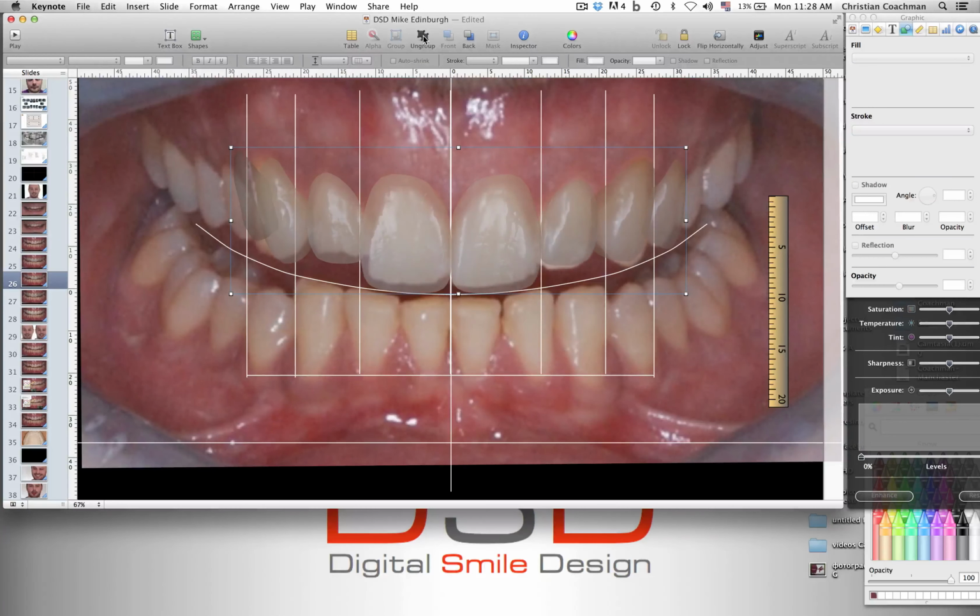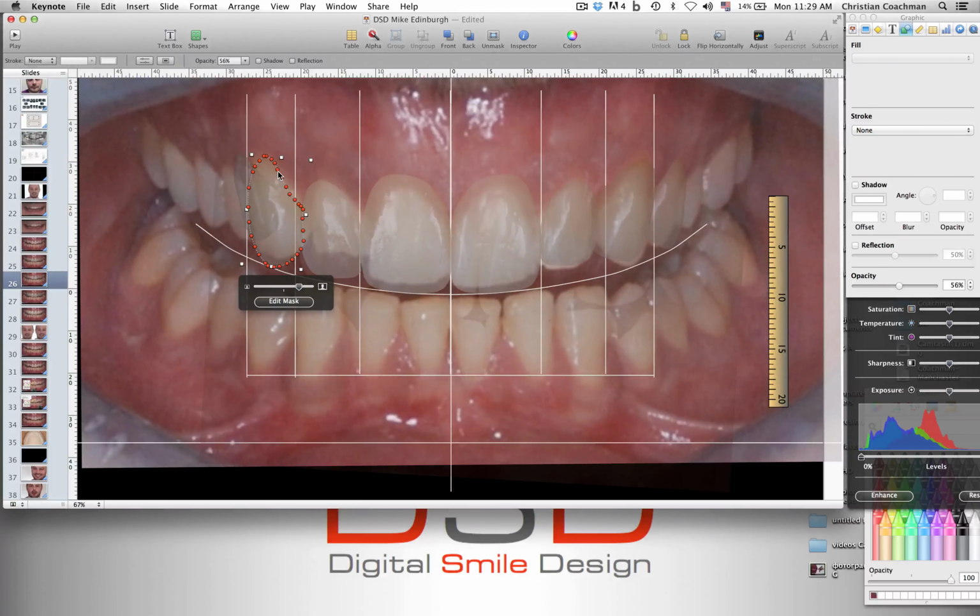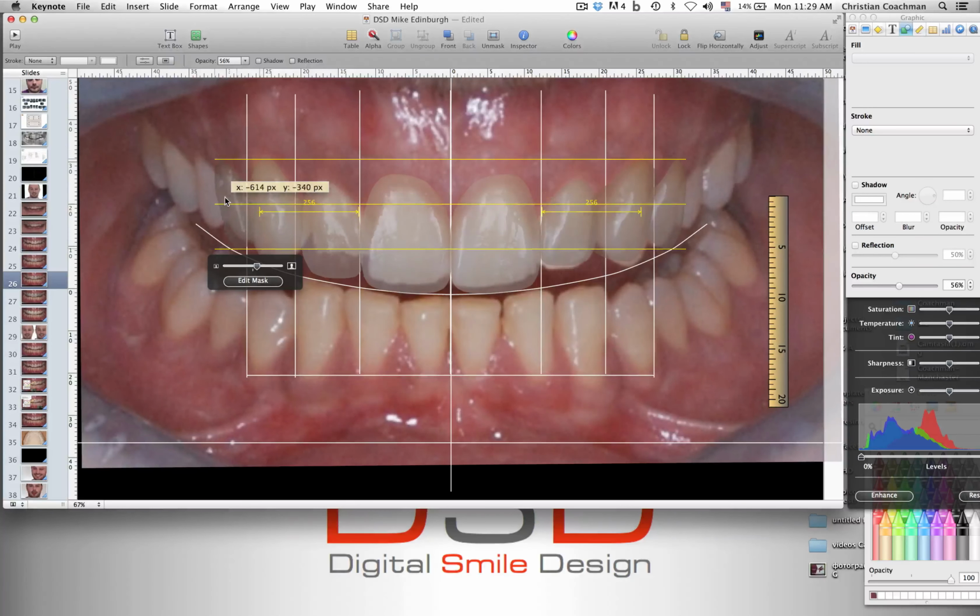Fit the centrals, then I can ungroup them. And I can fit the others as I want here. I can change the shapes, turn them as I want. I can actually change the contour by double clicking, double clicking and then just stretching. Change the contours of the tissue, for example. I can change the contours, put the bicuspid in position.